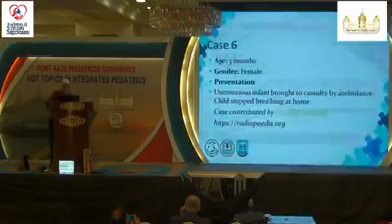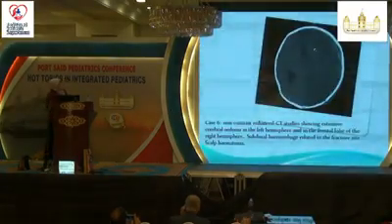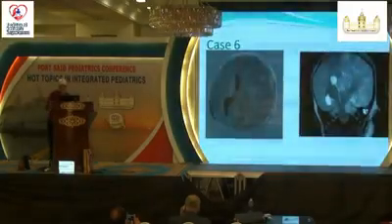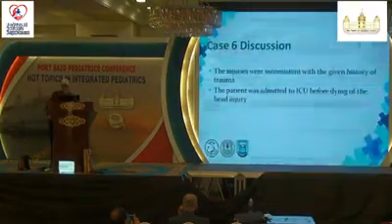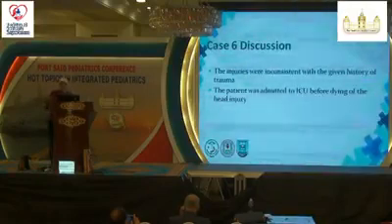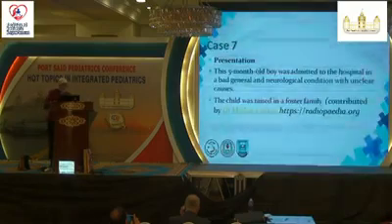A 3-month female, unconscious infant. Okay, we found this brain edema on the left side and a subdural hematoma. And this is the MRI finding of the same baby. The history was inconsistent with the given history of injuries, and the patient was admitted to ICU dying. No history of trauma. This is very severe to be just a fall from a table or bed.